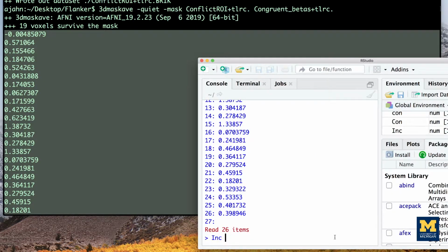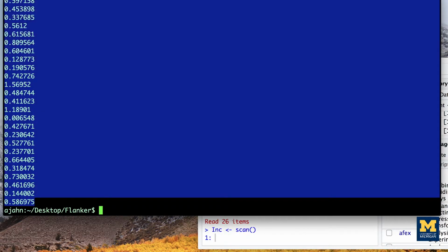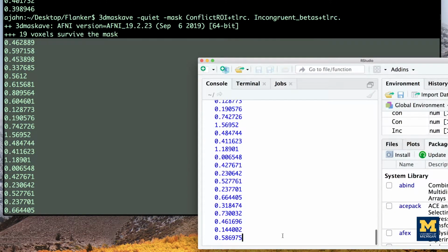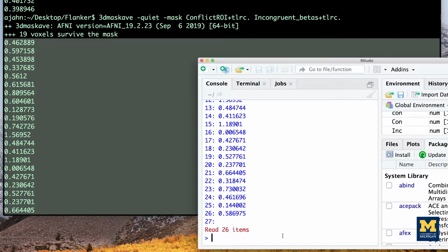Here I'm going to use the same steps as we used for the anatomical ROI analysis. The numbers you get from this analysis should look different from the ones you created using the anatomical mask, which reflects our more targeted analysis approach.